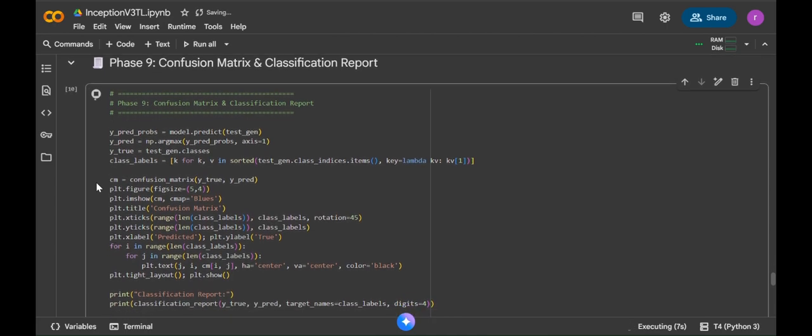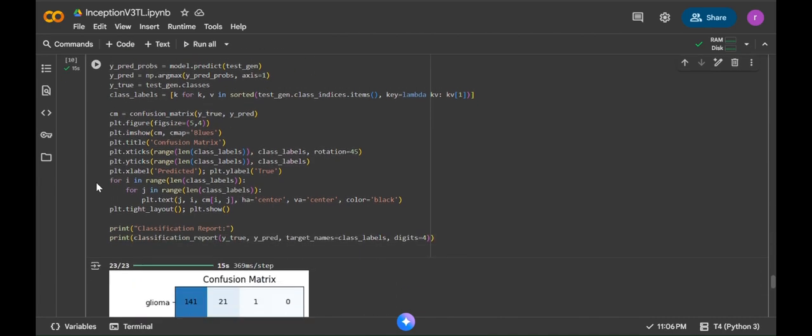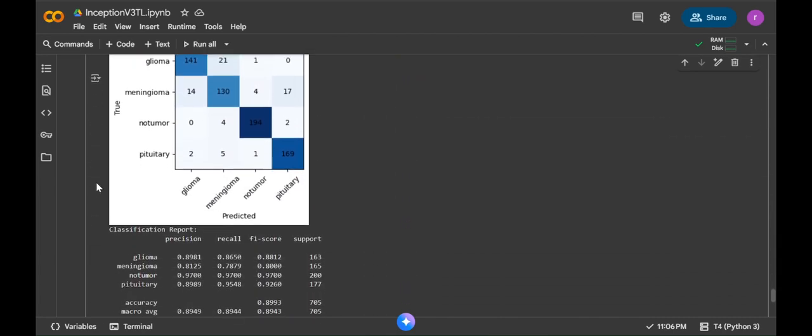Each image in the dataset is an MRI slice that represents different views of the brain: axial, coronal, and sagittal. These multiple perspectives allow the models to learn how tumors appear from various angles and positions.